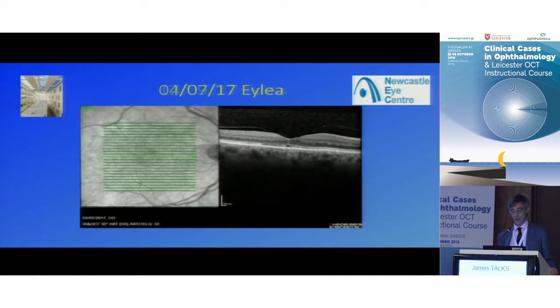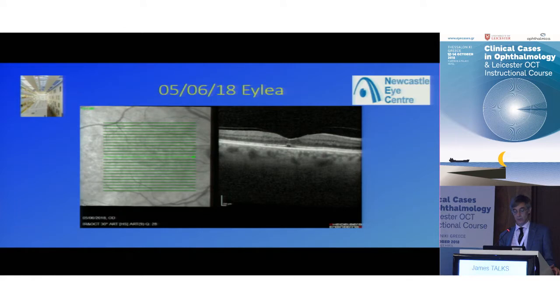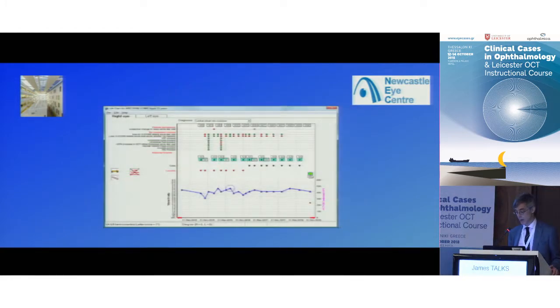July 17, September, and where we're keeping injecting now. But they have remained stable. We've now gone into this year, and now we're back up to just a couple of weeks ago. So they're not getting that many injections, about once every 3 months, but we haven't had that wild fluctuation of fluid. What's happened with the vision over all that time?